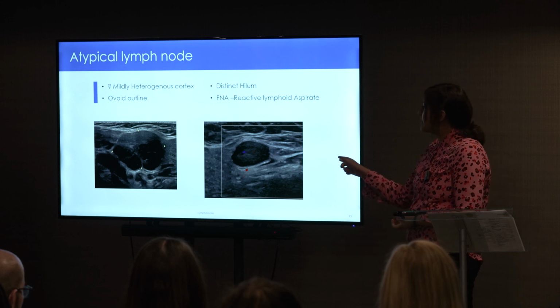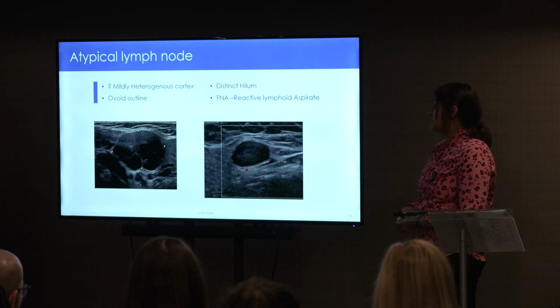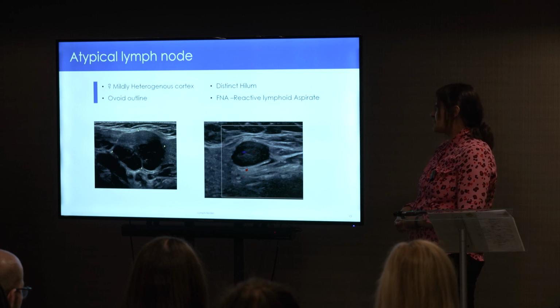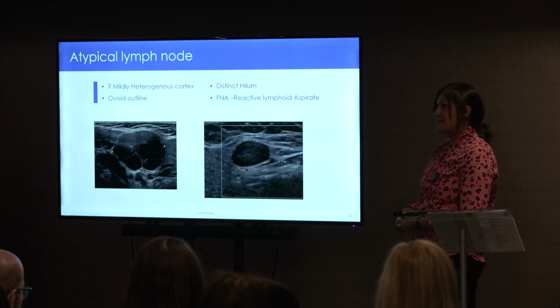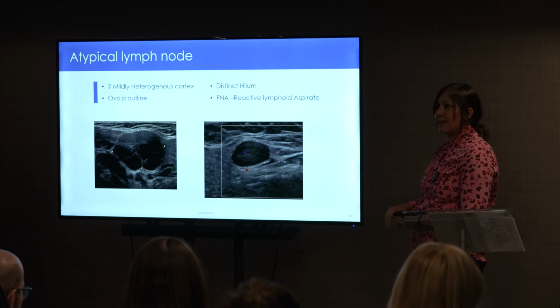And same for this node on the right side. Actually, I had a high level of suspicion, as the patient did have a background of treated oropharyngeal malignancy. And although this came back as reactive, it was discussed at MDT, and they repeated it a few months later. Unfortunately, by this time, the nodes had progressed throughout the neck, and this came back as a recurrence of an SCC. So what I'd say is just always go by your clinical judgment, and we will act on it as well as radiologists.